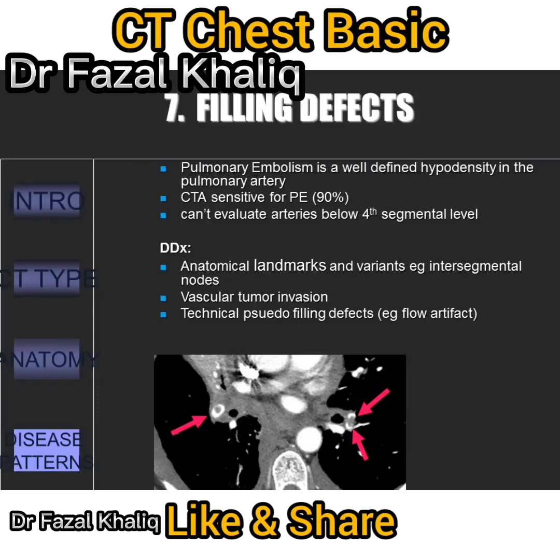Also, there are some interpretation pitfalls. For instance, anatomic landmarks and variants, like intersegmental nodes, frequently cause filling defects. Also, vascular tumor invasion may look like this. In fact, the radiologist looking at this scan couldn't tell if the filling defects on the left were from pulmonary embolism or tumor invasion.